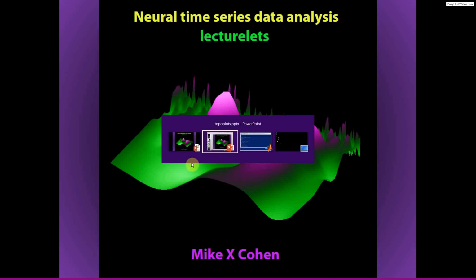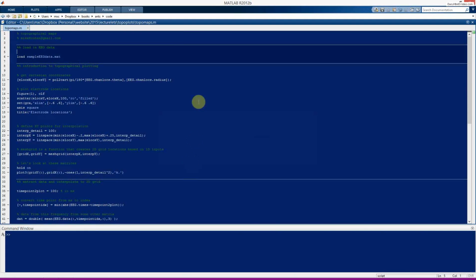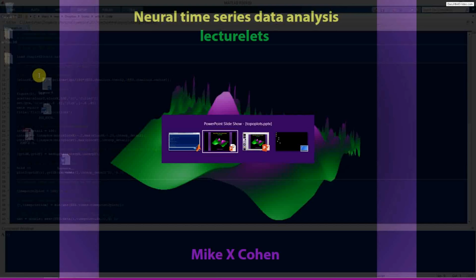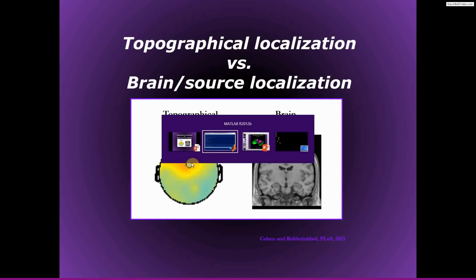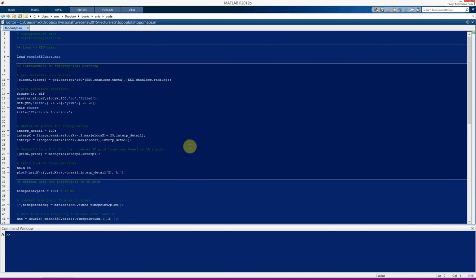Okay, so now I'd like to switch to MATLAB here. If you download the sample EEG data and the code that is presented along with this video, you can follow along with this script. What I'm going to do is introduce you to topographical plotting. Basically, I'm going to show you how these kinds of topographical plots are produced in MATLAB.